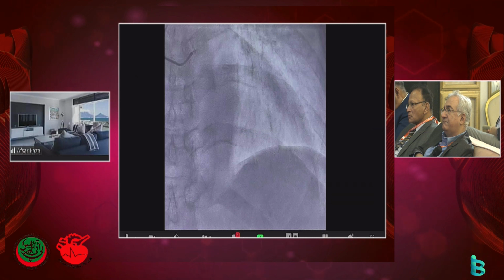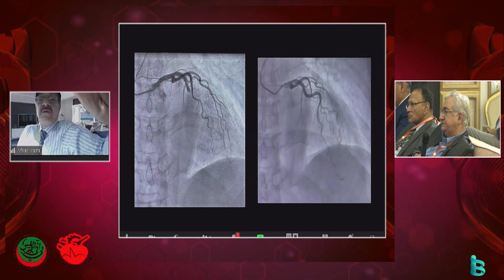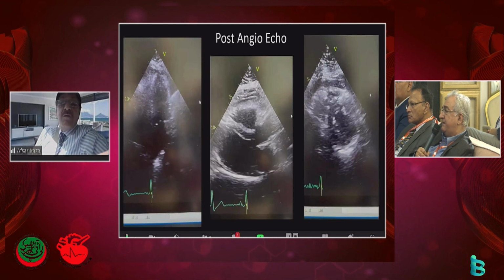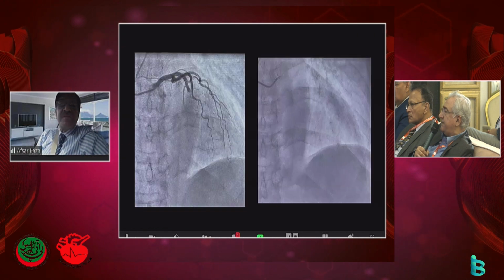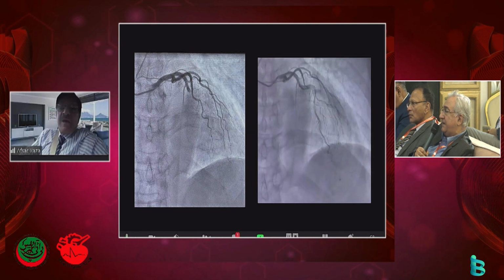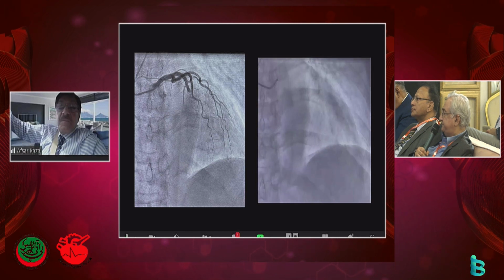If you see the last picture, young female, when this occlusion was there, the patient was stable. After the first few views, the patient crashed, with VTs, and it seems something happened. The only thing I can think of is that more air went down the system.